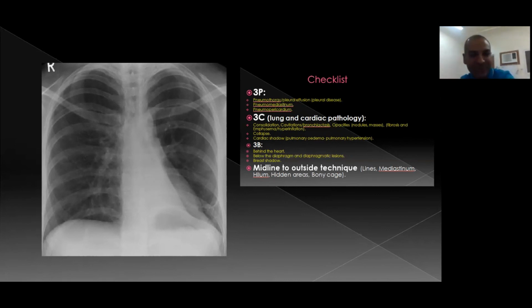Thank you. There is a retrocardiac triangular opacity. Yeah, you're right. Collapsed left lower lobe. Yeah, you are right. Exactly. Well done. We have here a triangular opacity obscuring part of the left diaphragmatic copula. This one is clearly identified, but this one is not identified. And this is a normal cardiac shadow.